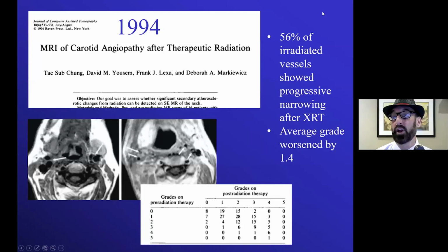Finally, of those large vessel vasculopathies that may affect the intracranial or the extracranial vessels, I should report on those patients who are affected by radiation. Radiation, while it can lead to a vasculopathy in and of itself, also leads to acceleration of atherosclerotic disease.